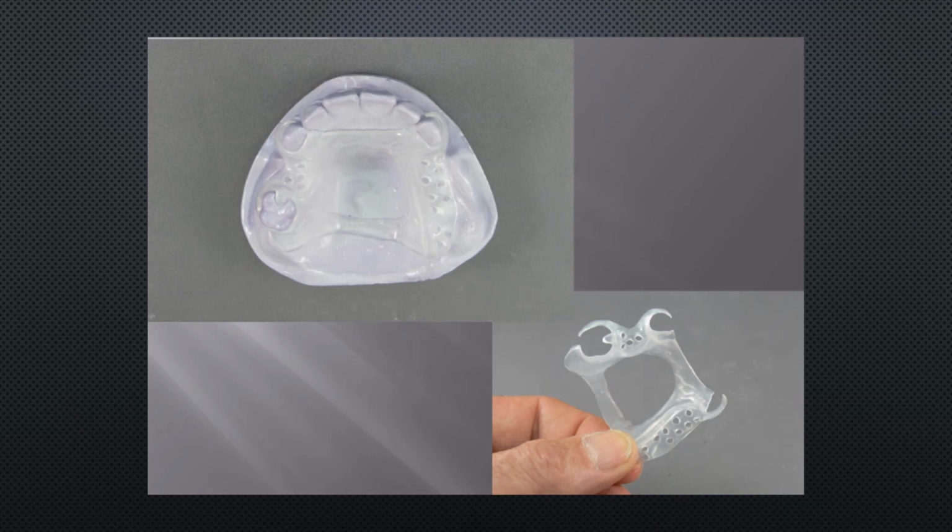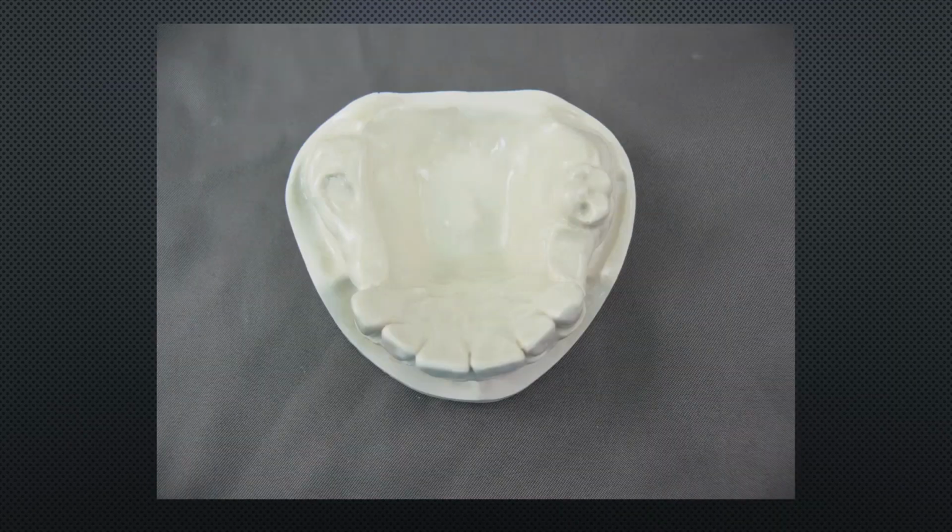All right, so that's our digital design. Real quickly, I'm going to go through what you would go through to actually process one by injecting it. Most every machine out there will process the VisiClear and or Duraflex. But the one thing to keep in mind is not every machine is super accurate, so you want to dial in temperatures a little bit.